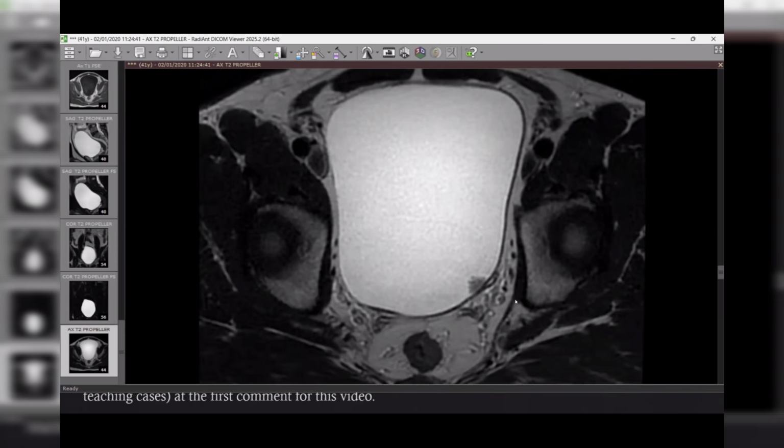Okay. By the way, can you give me an idea about the normal dimensions of the urinary bladder wall? Because it's 2 to 3 mm, not more than 3 mm. It's from 2 to 8 millimeters, according to the urinary bladder distension. And by the way, the mucosa and submucosa are not well demarcated in the T2 weighted image. In the T2 weighted image, we can only see the dark, low signal intensity of the muscle.